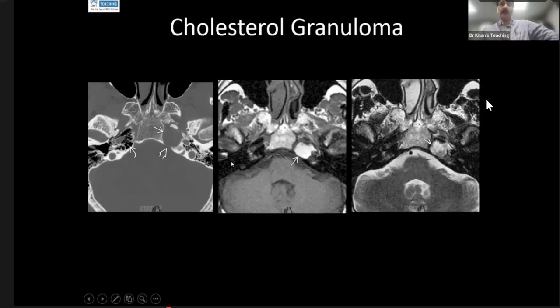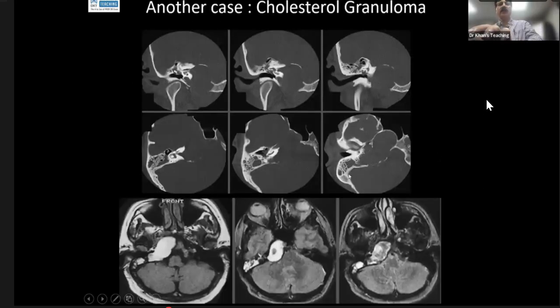And this is another cholesterol granuloma. But the key thing, this is not as expansile as the one I showed you from STATdx. The key finding is, look at this T1. And if you look carefully on this T2 weighted sequence, you can argue that the rim is showing hemosiderin. Another example from, I think, the American College of Radiology. It is causing a huge expansile lesion, and you can see that there is a bit of a hemosiderin rim. Cholesterol granuloma.